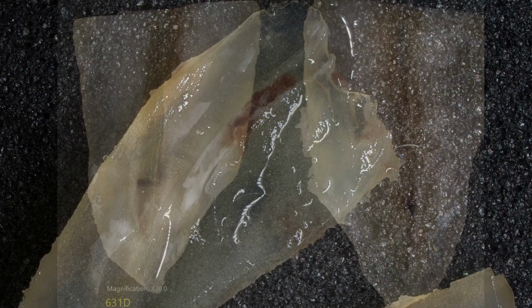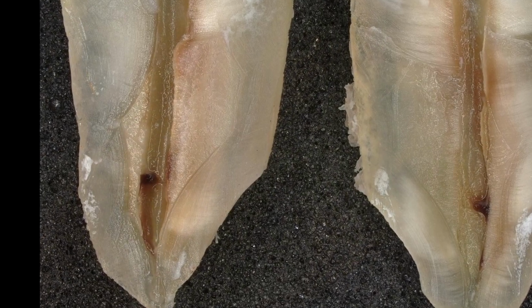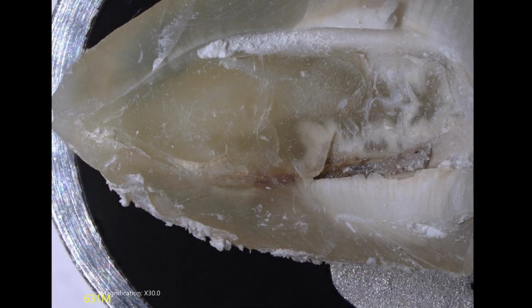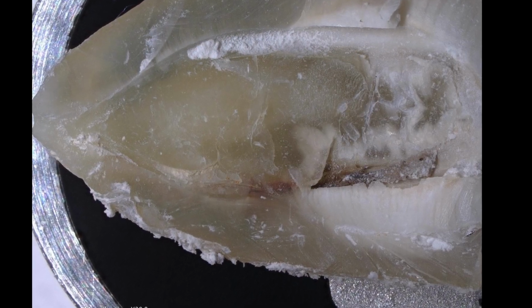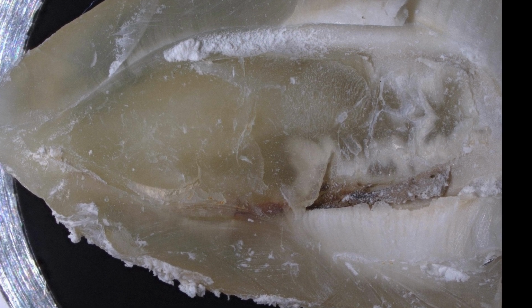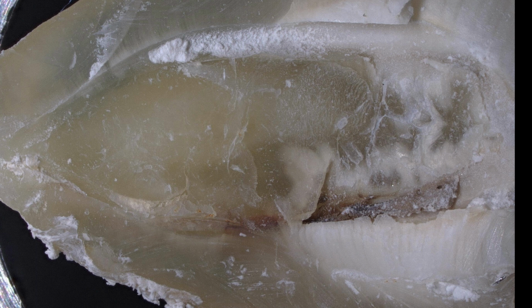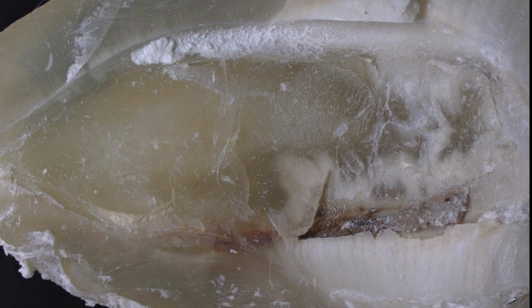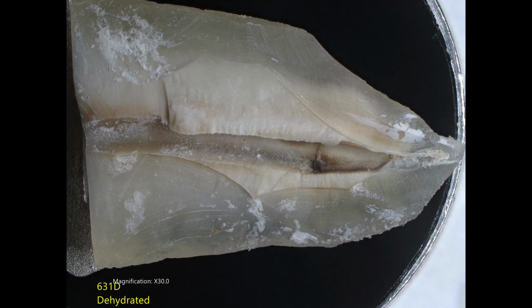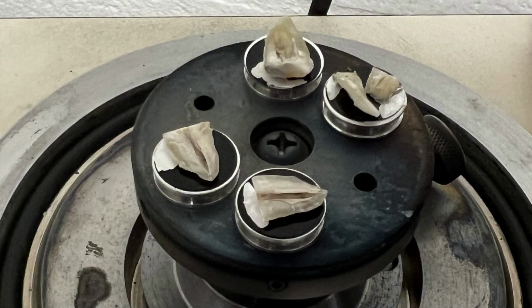This is a fragment of the mesial root, and this is what the distal root looked like. I'll go over more of this in the final report. These are what they look like dehydrated. So you can see a lot of that debris on the mesiobuccal canal is from the sectioning. So I'm not going to spend much time looking at that because it's hard to interpret.